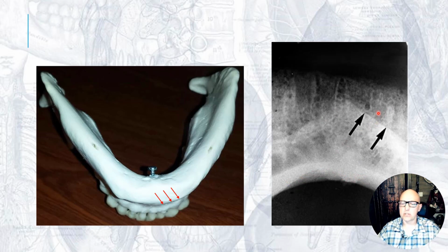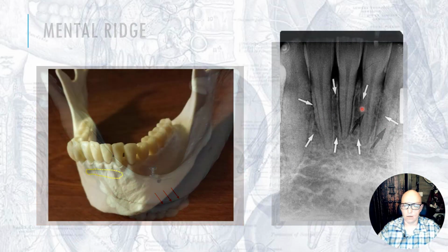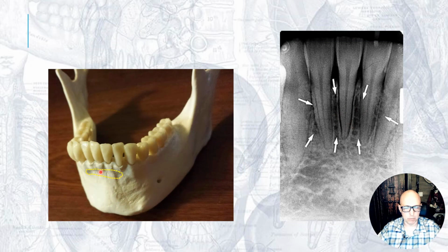And so this sometimes you'll see when you take a steep anterior mandibular radiograph and you just project that ridge of bone over the radiograph. And so that's called the mental ridge. Again, the mentum region, mental ridge. So if you see that projected in the anterior mandibular radiograph, just the mental ridge. All right, what would this be? Remember the term for this when there's a depression in the bone? What do we call that? That's a fossa.